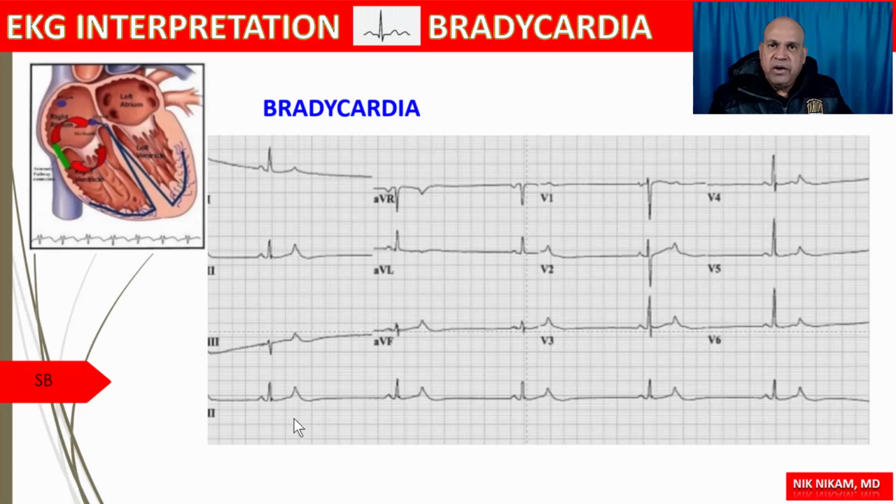If it's a ventricular ectopic beat, obviously you're going to see the wide QRS complex and you can easily identify. However, if it's a blocked atrial beat, then you will have a hard time determining whether that is actually a blocked atrial beat or whether this is just garden variety severe bradycardia.